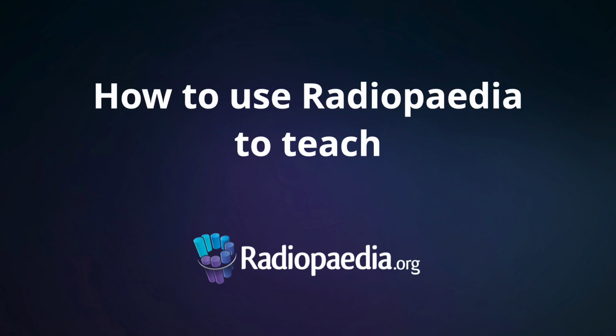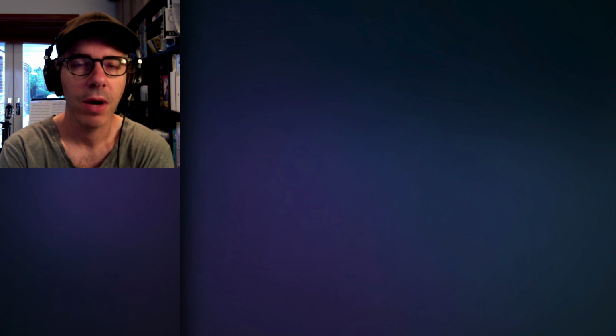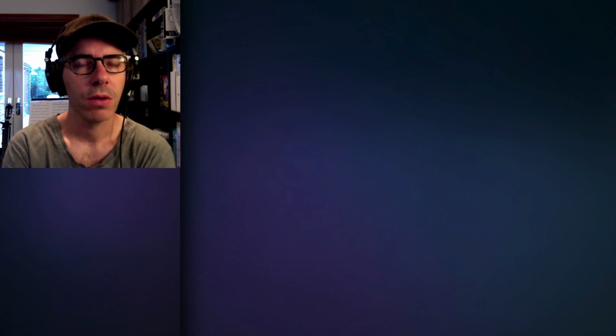Good morning. Since COVID has resulted in many of us being stuck at home, and social distancing has meant that even those of us who are at work cannot teach how we normally teach, I've received many inquiries about how I use Radiopaedia to give tutorials. So I thought I'd go through this very quickly and informally.